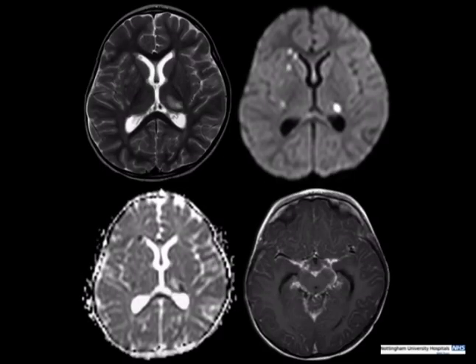On the top left-hand corner, you can see axial T2 weighted imaging with focal high signal intensity in the left thalamus, where we saw it on the CT, and spotty T2 hyperintensities that, when we look on the axial DWI and ADC map, show diffusion restriction. Diffusion restriction is probably an infarct, and in the context of sepsis, these are perforator territory infarcts due to all of the pus and infection around the base of the brain surrounding these perforating vessels.